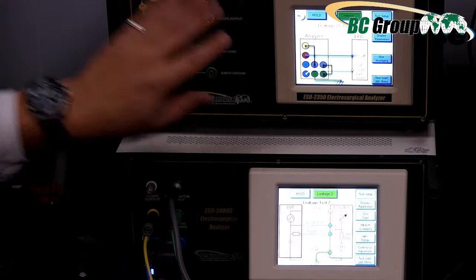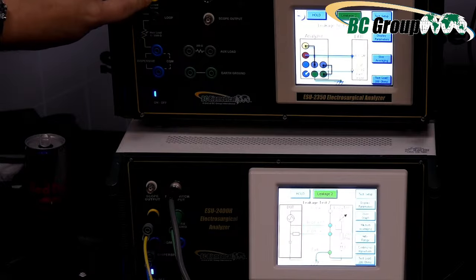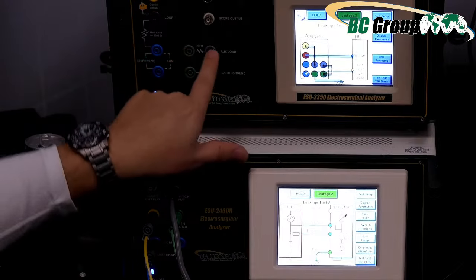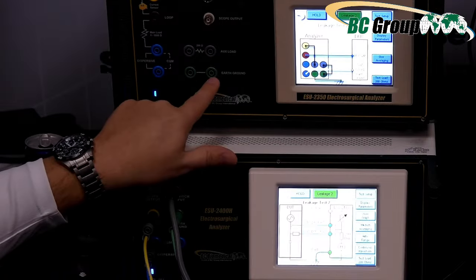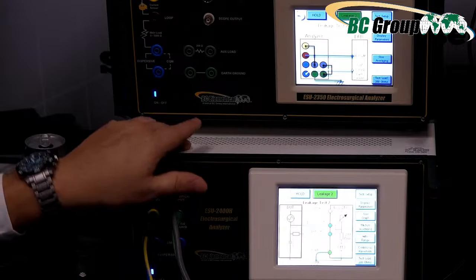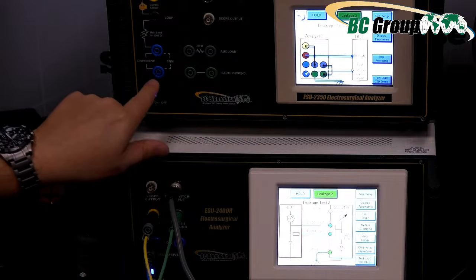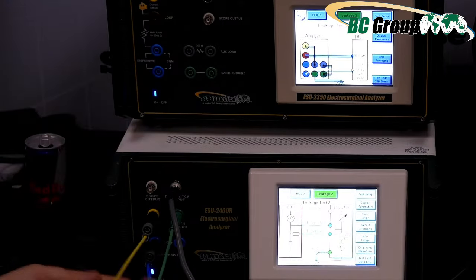Okay, so on this one here, I'm supposed to connect 1 cable from this one, which is the active, to that 200 ohm. So I'm depicting a human. What if you went up and touched the device? And then you have output from 200 ohm, supposed to connect to one of the greens right here. And it's so easy to follow, guys. Yes, you have to set up some stuff, but it's super easy. And then the green right here is the same green right here. It connects to the lug on the back of the device. And the bottom, the dispersive, now goes to your yellow.